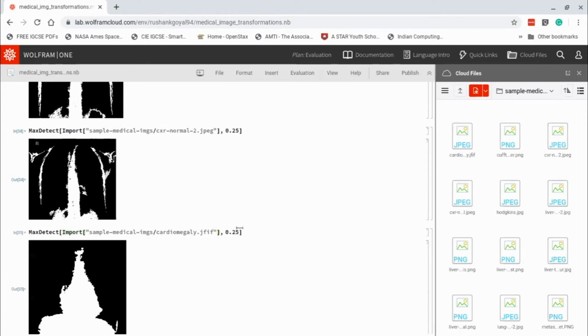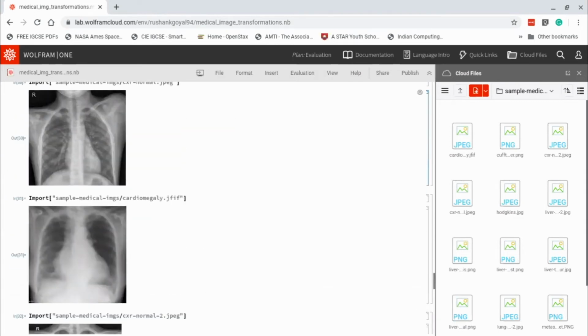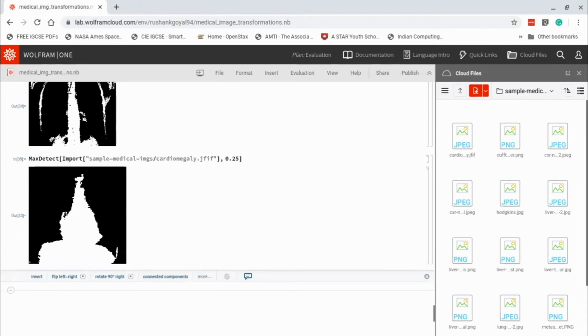Okay, so this is clearly much different because the heart is bigger. So there's this huge region of white. And now you might wonder why the rib cage is not appearing. As I said, when the X-ray machine renders these images, there's only a scale it can go, like a monochrome scale. So if the heart becomes brighter, the other stuff has to become dimmer to compensate. Right, that makes sense.